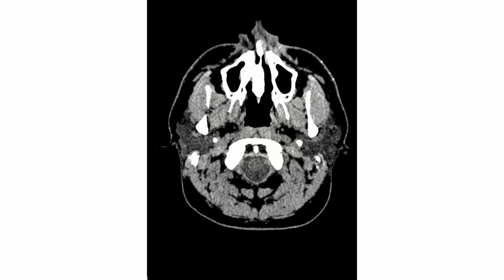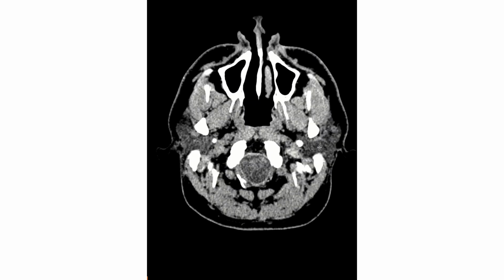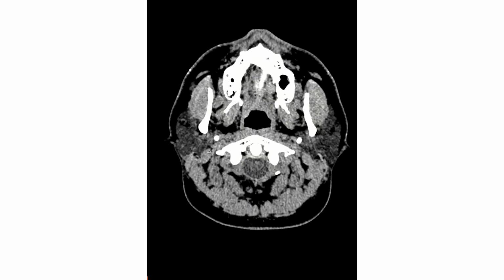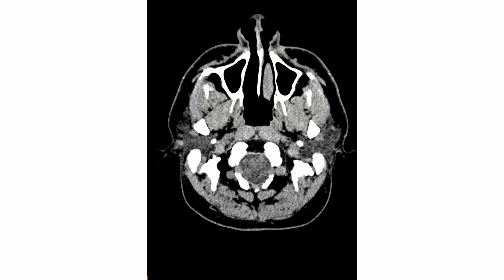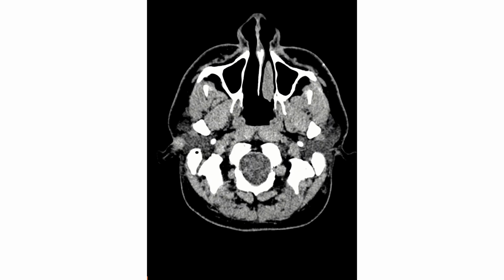And then the other structure that is very important in head CTs is the parotid gland. Sometimes we forget, we are rushing through the brain parenchyma looking for hemorrhage, but this area, parotid glands, you should make sure that you look at it on every single case, because this is the area where you might see incidental tumors or parotid gland lesions or other pathology going on. So make sure you always, every single case, look at your parotid, look at your nasopharynx. These are our blind spots that usually may cause some incidental findings to get missed. And this is the parapharyngeal fat pad. We make sure it's very well defined and there is no pathology here.